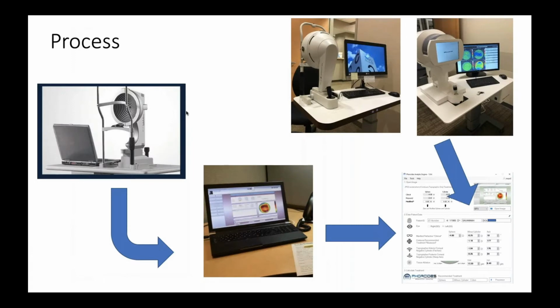Now, how does this play out in your clinic? Well, really, your process is not going to change very much. We all get Vario scans on patients that are going to have Contura. And after the technician has found the Vario scans, they've analyzed them, they bring them to the Alcon planning laptop. At the Alcon Contura planning laptop, you will zero out the sphere and cylinder so that you get the purely topographical treatment map. We have a way to save these images and then bring those images into the Phorcides software.